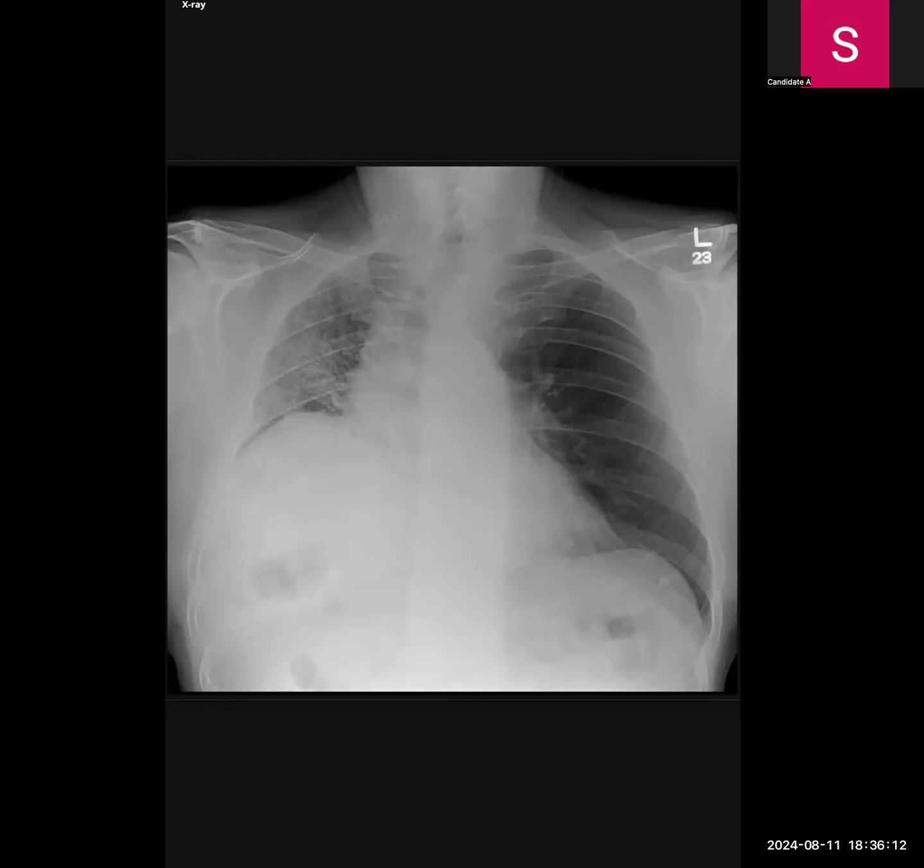So with these reticular nodular opacities, these could be, okay, a large mass noted in the right lower zone with a lymphangitic carcinomatosis with involvement of the mediastinum as well. Other differentials could be. Your time's up.